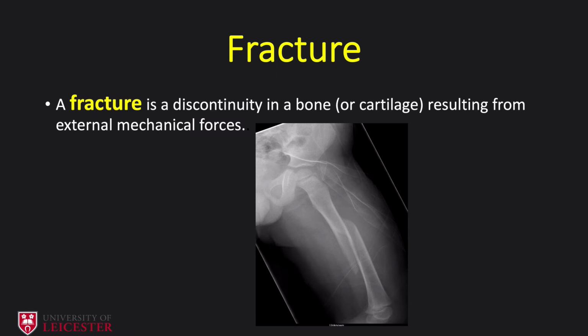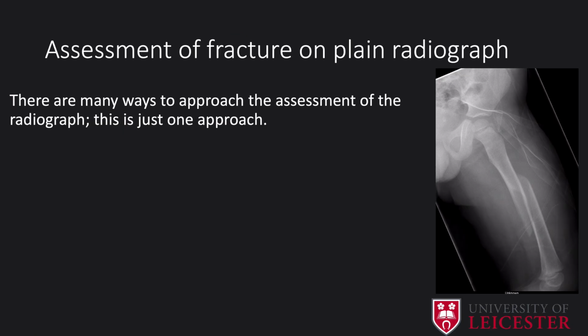The second part of my lecture is about fractures, how to identify and describe a fracture. The definition of a fracture is simply a discontinuation of the bone resulting from external mechanical forces. There are many ways to approach the assessment of a fracture on the radiograph, and this is the simplest one.